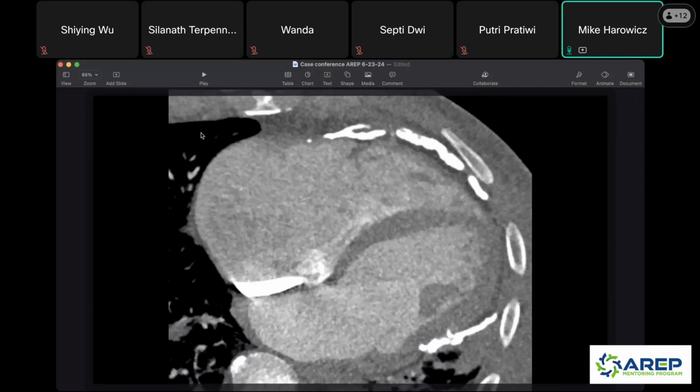And so let's remember where we're looking. So right atrium, right ventricle, left atrium, left ventricle. And it is a contrasted exam. I'll tell you that this right here is just contrast that's pooling. It's probably getting into the IVC. So what I noticed is, what is all this stuff, right? This high density stuff that's around the heart. Now you don't have any vessels that normally course there, right? So although it looks similar to the contrast, this is a little bit different. And so the heart looks funny.